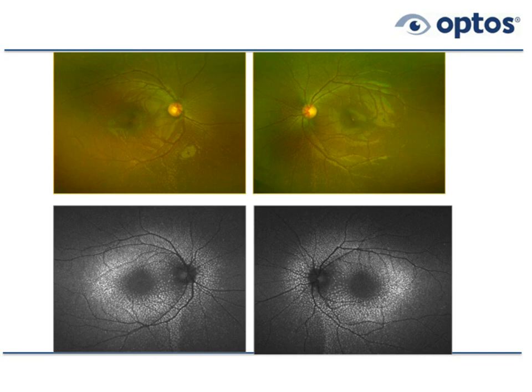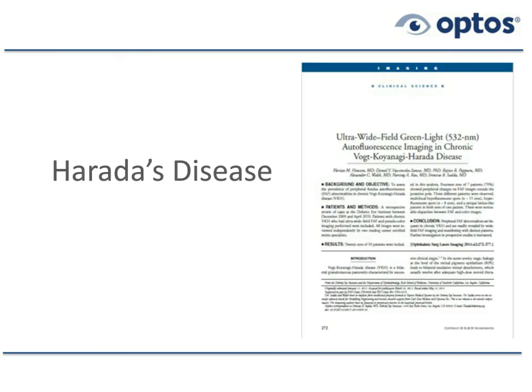Some young patients have such dramatic reflections off the internal limiting membrane that we can't even see below it to get some sense of what's going on. In any case, you can see this patient has a whole series of little dots and spots, which are much more obvious on autofluorescence than they were on the color images. Okay? Let's talk about Harada's disease.